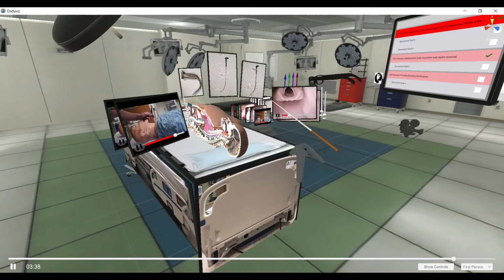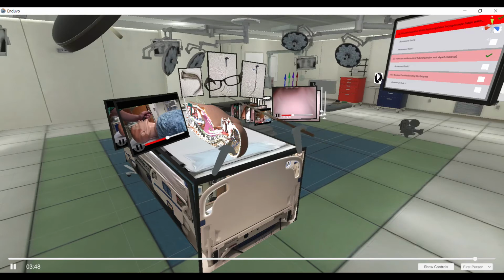Feel free to pause the lesson, watch any of these videos again. You can also practice on the anatomic model utilizing your hyperangulated blade and visualizing how it goes behind the posterior tongue. And when you're ready, you may push play and continue to the next lesson.